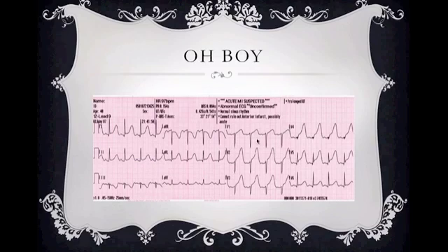All right. Oh boy, what do we got? Well, let's see. Again, big, massive T waves. These are really wide. Look at the base of that sucker. That thing is huge, right? So that is a wide, rounded T wave. Big. It kind of swallows up that S wave there. But I also have some negative deflected T waves here in 3, but not too contiguous. I also have really deep T waves in aVR and some depression. So this is, again, hyperacute T waves of a massive septal anterior wall MI.